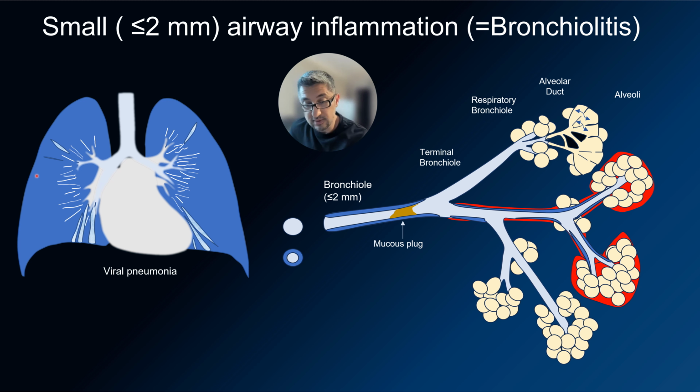So in this case, the main findings of viral pneumonia are hyperinflation, peribronchial interstitial opacities, peribronchial thickening, and also atelectasis, which could be subsegmental or segmental or lobar. Peribronchial areas and infrahilar regions are the most common for these subsegmental atelectasis, and right upper lobe atelectasis is the most common, especially associated with RSV.